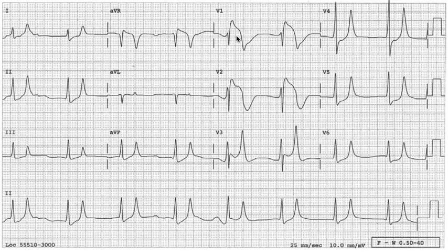The reason for that is because in severe hyperkalemia, the potassium inactivates the sodium channel, which creates a pattern similar to Brugada syndrome, which is a sodium channelopathy syndrome. The other thing, when you look at the rhythm strip, you can appreciate the disappearance of P waves. So why is that happening?